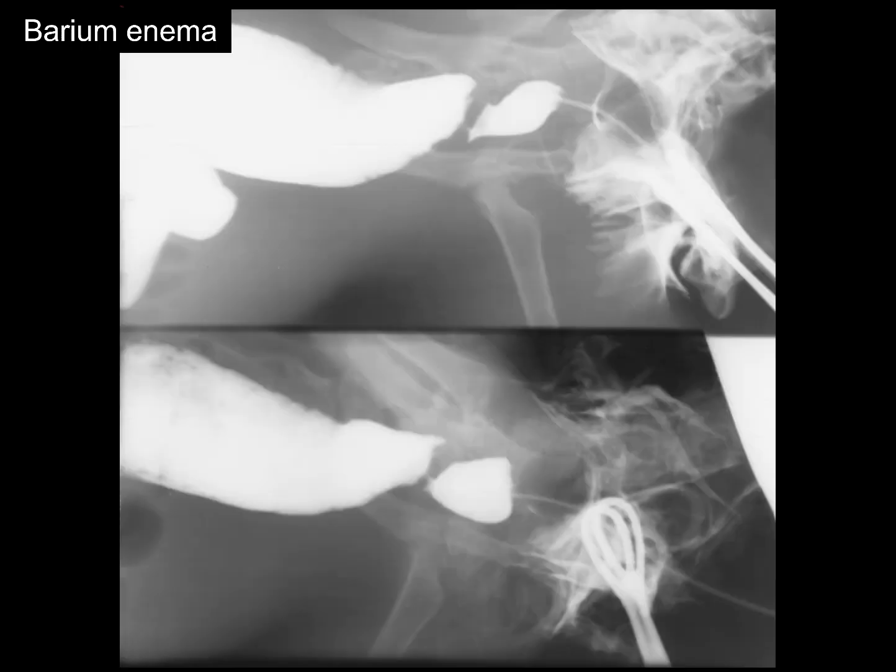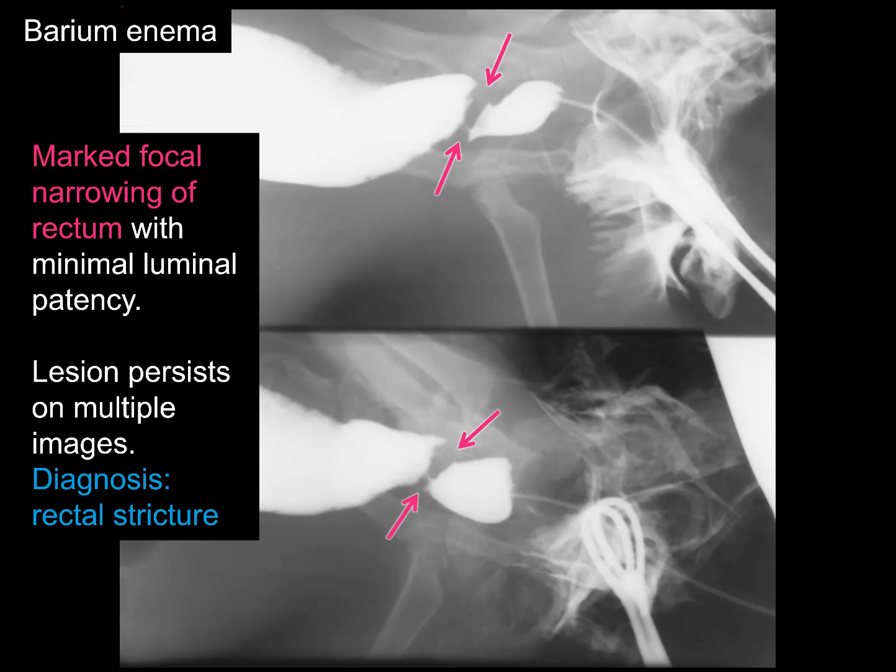Again, just a couple more views. Very, very little contrast medium in the lumen at that point, so this is a rectal stricture.